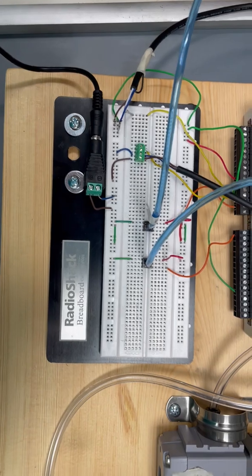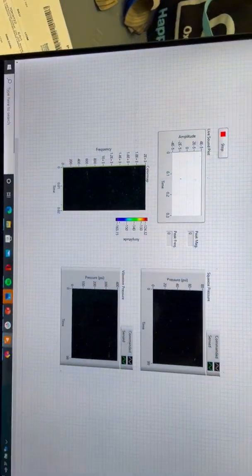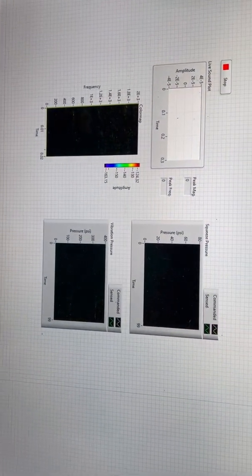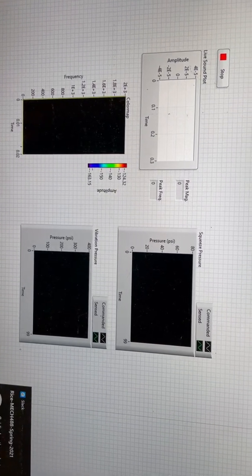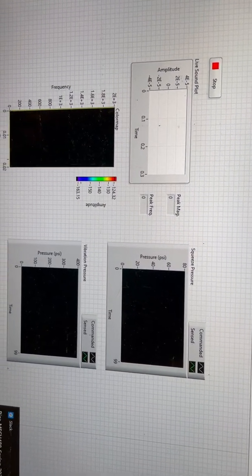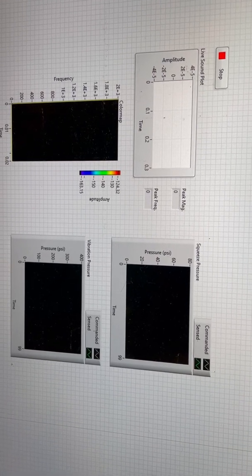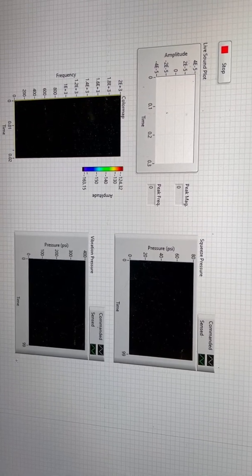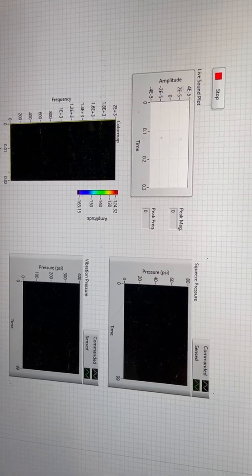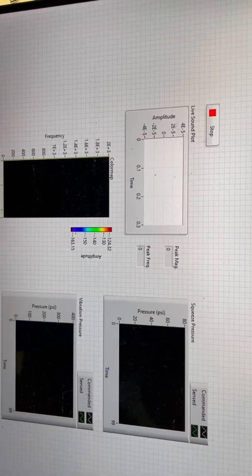All computation was performed in a LabVIEW VI. The GUI for this VI can be seen right here. What this VI did is it took the sound output of our computer through a virtual audio cable. With that, it analyzed it using a short-time fast Fourier transform to get the amplitude and frequency characteristics of the sound. The amplitude was mapped directly to squeeze pressure through an empirical matching between the voltage to the regulator and the amplitude of the sound.